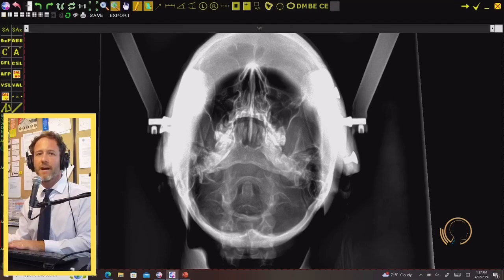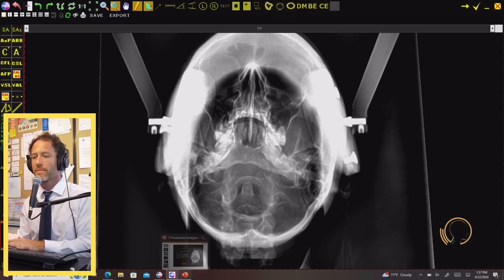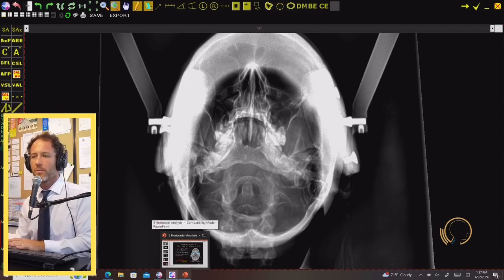All right, it's Dr. Collins with the Advanced Orthogonal Institute, and today we're doing the horizontal film. I also am including some PowerPoint slides from our seminars, just so you can get a little more technical detail, which I'll pull up here in a minute.